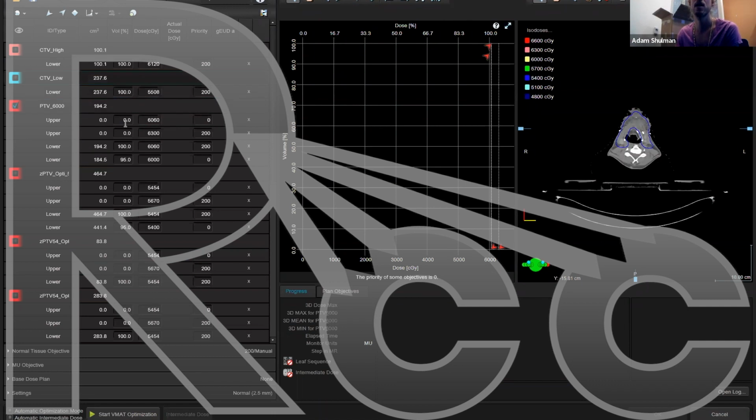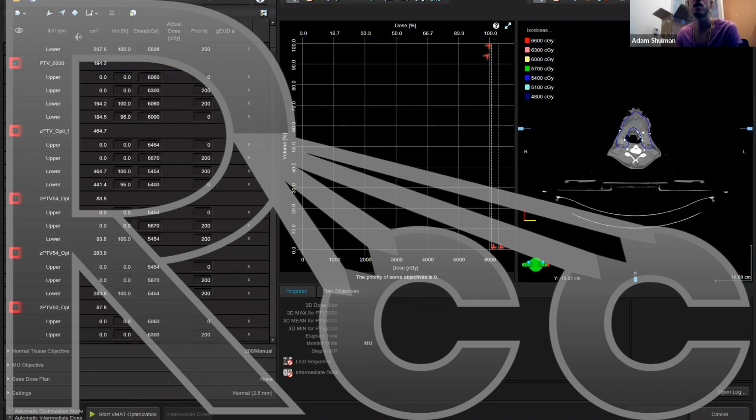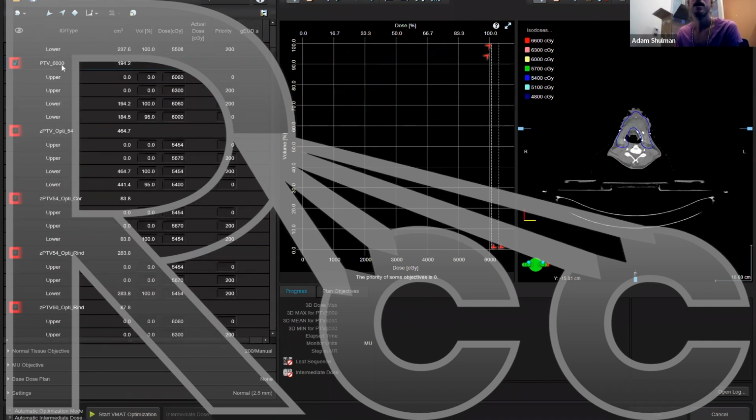Okay, so quickly, we've got starting objectives here. PTV 60, we've got a fake objective at 95%. I'm sorry, 95% of the volume being covered by the prescription. This is what we're trying to achieve. I want a V100 of 95%. Same with my PTV 54. I've got that fake objective. It's got 0 weighting. And then I start with 100% at 1% higher than prescription and 0% at 5% higher than prescription.